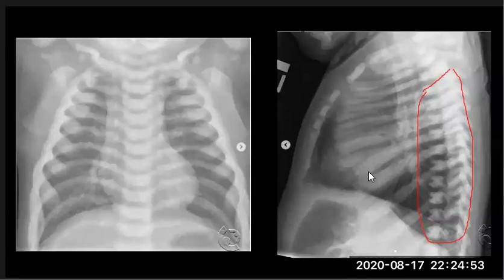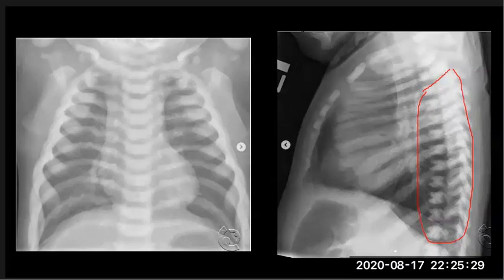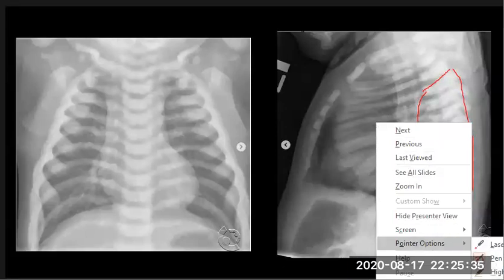Okay, this is osteopetrosis. It is an inherited disease, autosomal recessive. A patient sometimes comes with anemia, fracture, even a bleeding disorder. The bone is sclerosed, but it is brittle bone, fragile, the same terminology. Any question on this case?